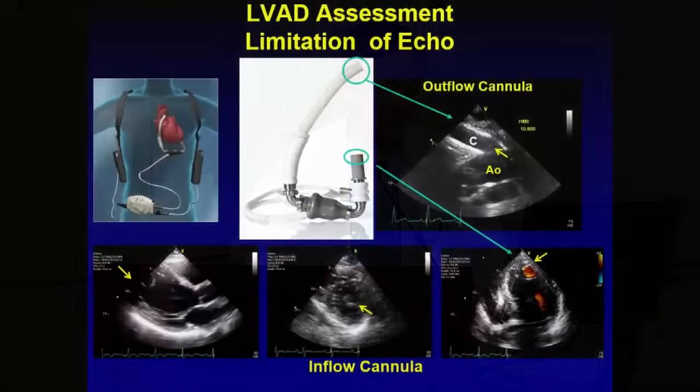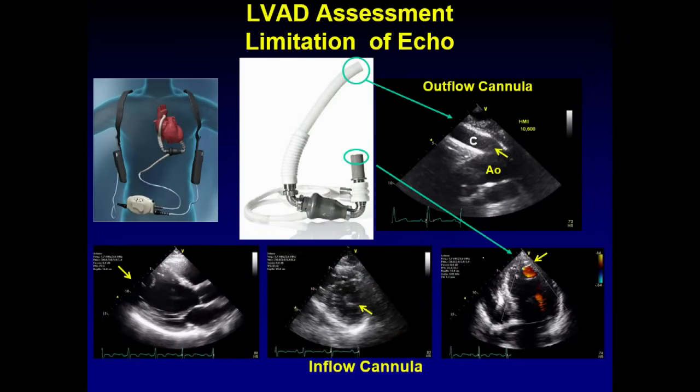Okay, all right. So real quick, very nice talk, and CT has an important role, and the main reason is this. You can see everything the echo shows. Basically, you're looking at the different ends of the LVAD device per se. Anything in between, for obvious reasons, we cannot see by echo. That's why CT comes in to decide.